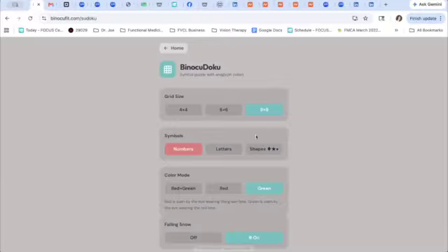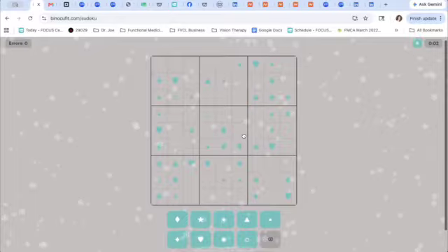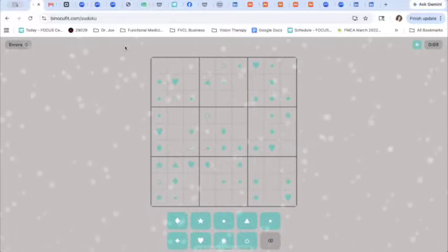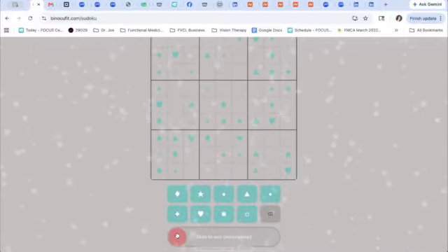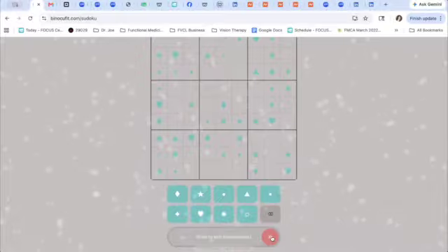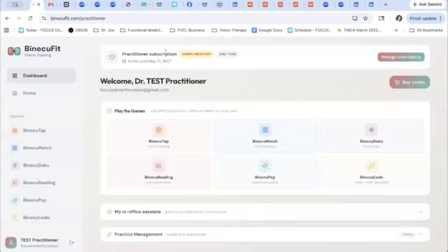And honestly, the shapes in the 9 by 9, I have not tried. But I think it's a very good exercise to go through if you can wrap your head around the strategy of doing something like that. Then I would imagine that could take 15 to 20 minutes to half an hour to go through that whole entire puzzle. Those have always been the points that are challenging to find activities for: the super young ones, and then the teenagers and adults who feel like this is all designed for babies. I'm going to skip to here to the BinocuPop.